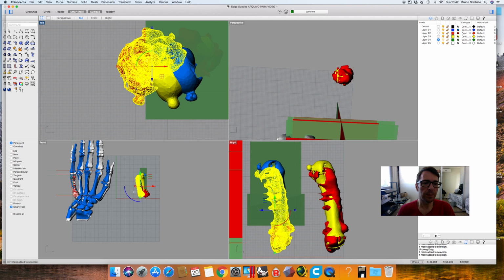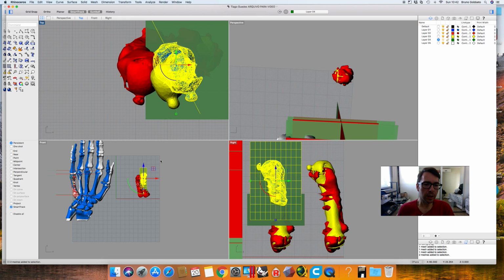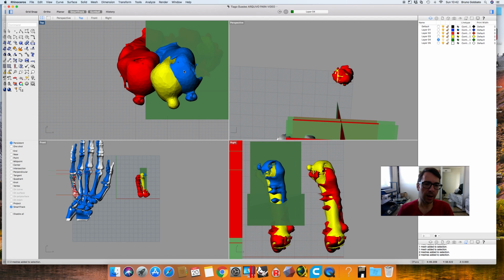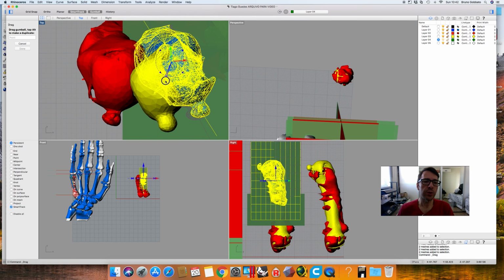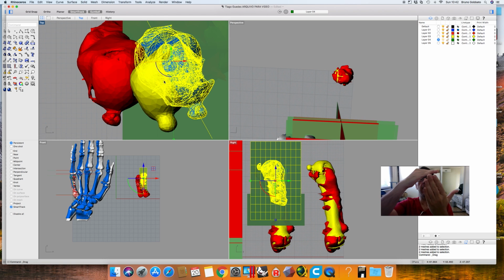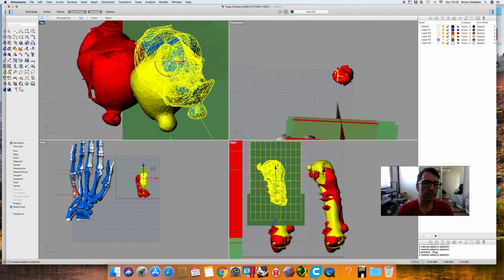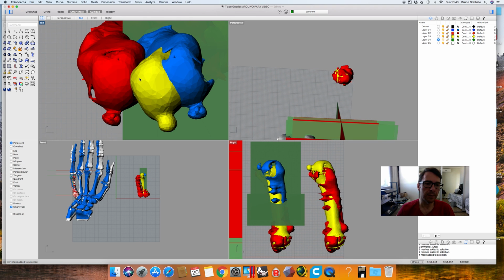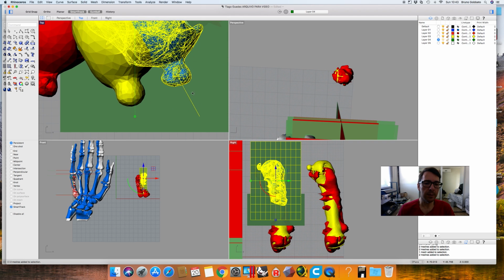We have here the affected metacarpal, okay, and the normal metacarpal, okay. And here in blue, we choose an osteotomy. We have done an osteotomy on the affected metacarpal and try to rotate it just like that in order to make sure it's aligned with the normal metacarpal in the rotation position, okay? And this is what we have achieved. We think these both files right here, yellow and blue, are now very well aligned in rotational deformity, and we can use this line here as a reference to check our rotational deformity.